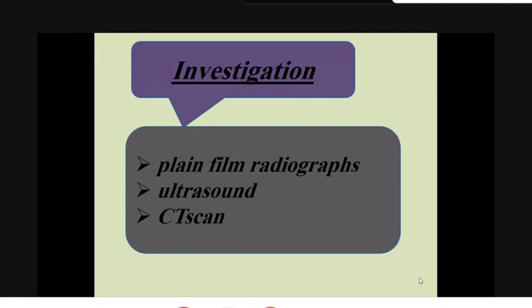The second reason, a number of chest conditions may present as acute abdominal pain and mimic acute abdomen. Patient may present with basal pneumonia. The clinical presentation resembles acute abdomen. So by using a chest X-ray, we can assess the bases of the lung, so it's easy to diagnose the cause of such acute abdominal pain.